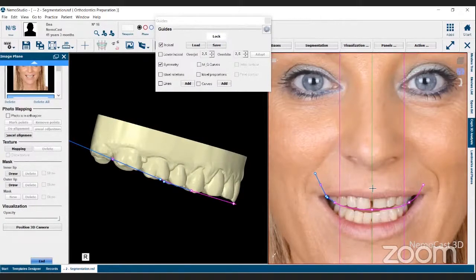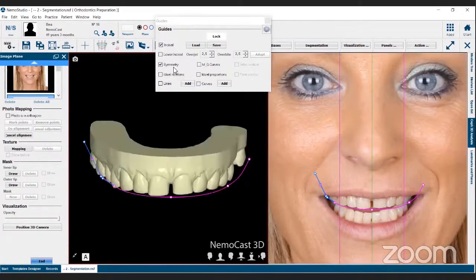Okay, so after placing both of these guidelines, then we come back and fix our canines to have the best balance possible. And then we're going to use our ideal relations. Okay, here we have the ideal relations. It's the relationships between the width of the canines, the lateral incisors, and the centrals. The centrals being our starting point. So here we can see the different percentages in the width.